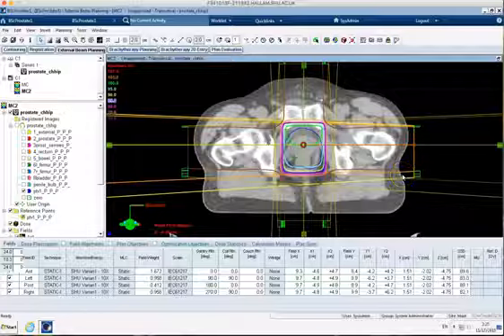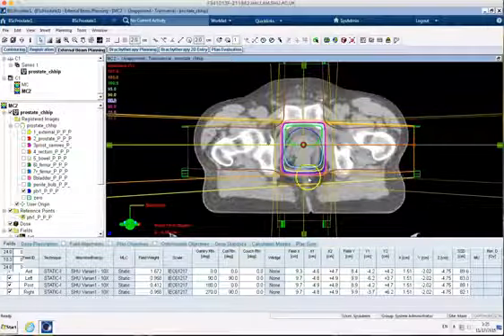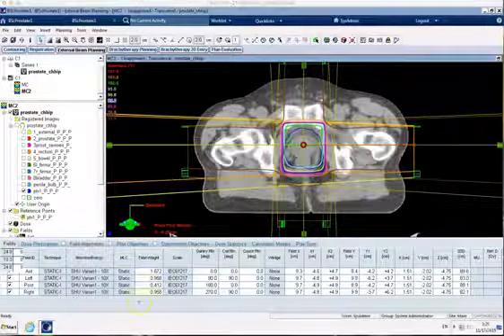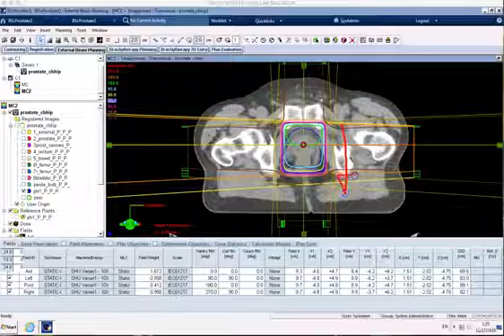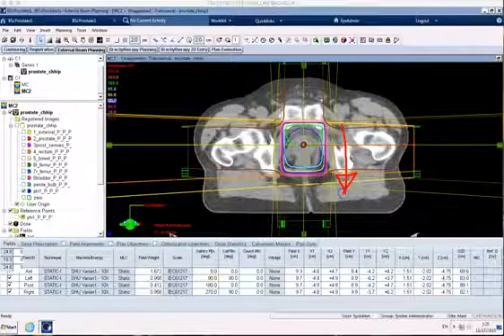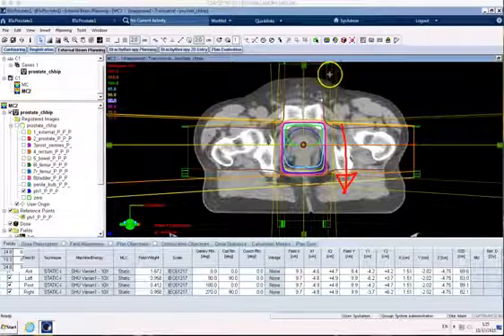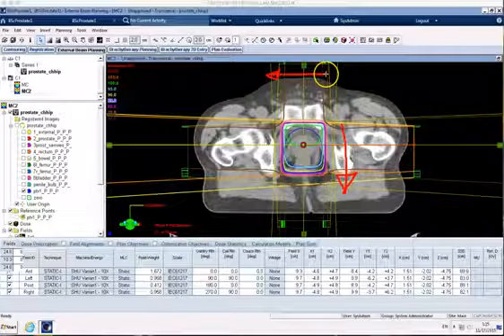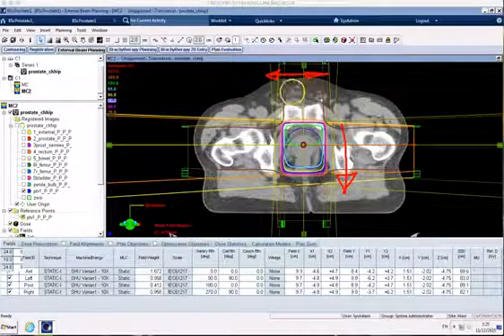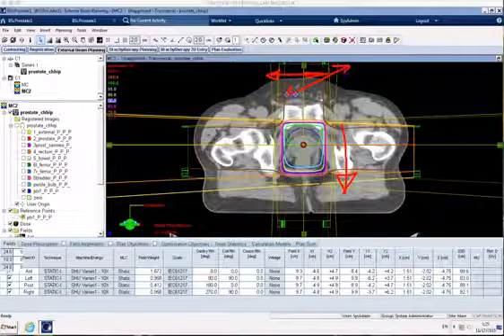If we think of a wedge as an arrow pushing dose in the direction we want it to be in, if I just have a go at drawing a line on here, we're wanting to push dose in that direction, if you'd agree with that. So that field is no use to us, because if we put a wedge up there, we've only got a choice of that way, or if I try and draw in 3D, superior to inferior, so that's no use to us.